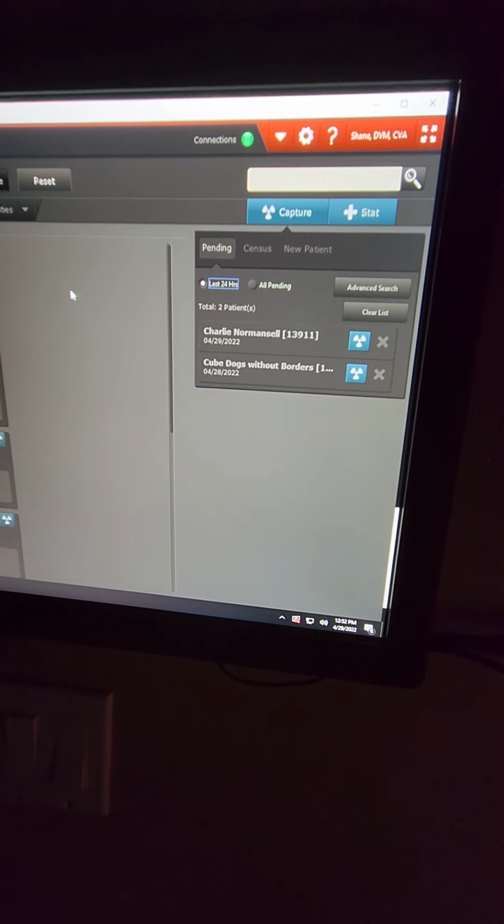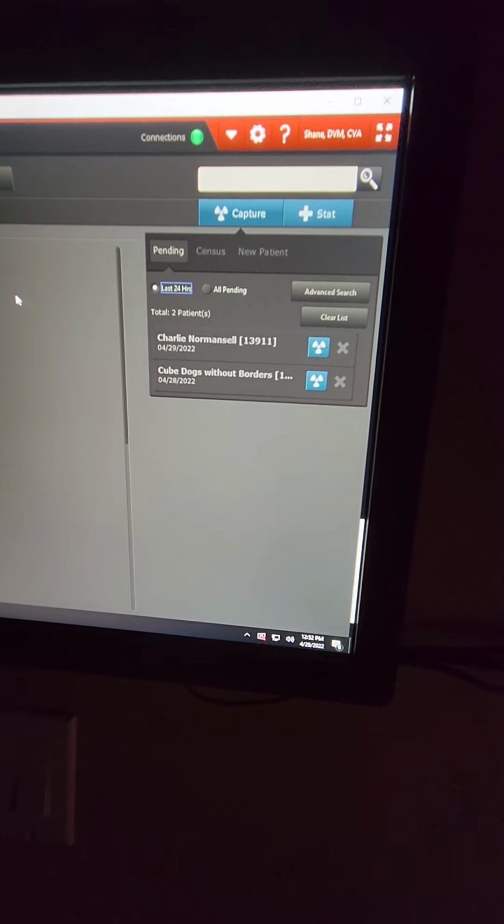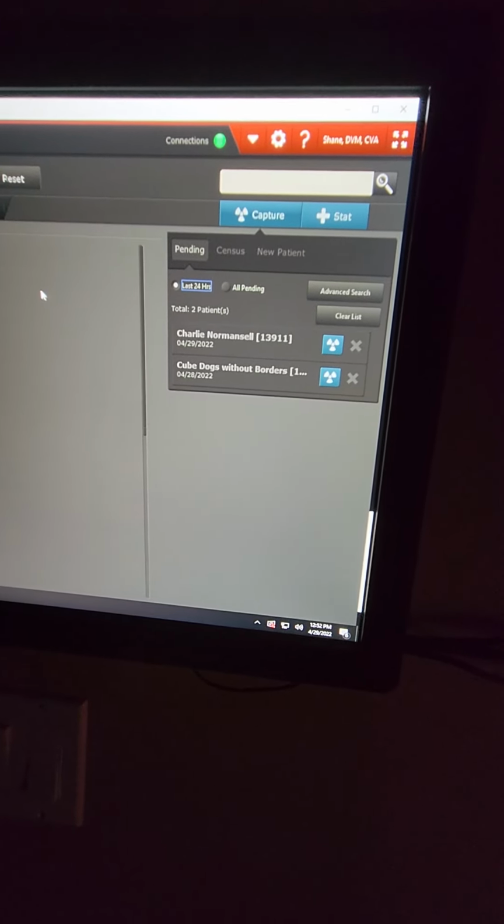It's just an option rather than if you want to look at the old school, that one, or if it's in here, either way. Okay. Yeah. Okay, that's it. All right. The buttons are the same as far as everything else? Yeah, everything else is the same.